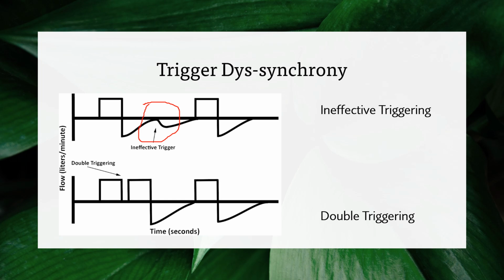And this is double triggering. It is characterized by two successive breaths without time to exhale, as you can see here that there is no expiration. This is observed in patients with high respiratory drive.